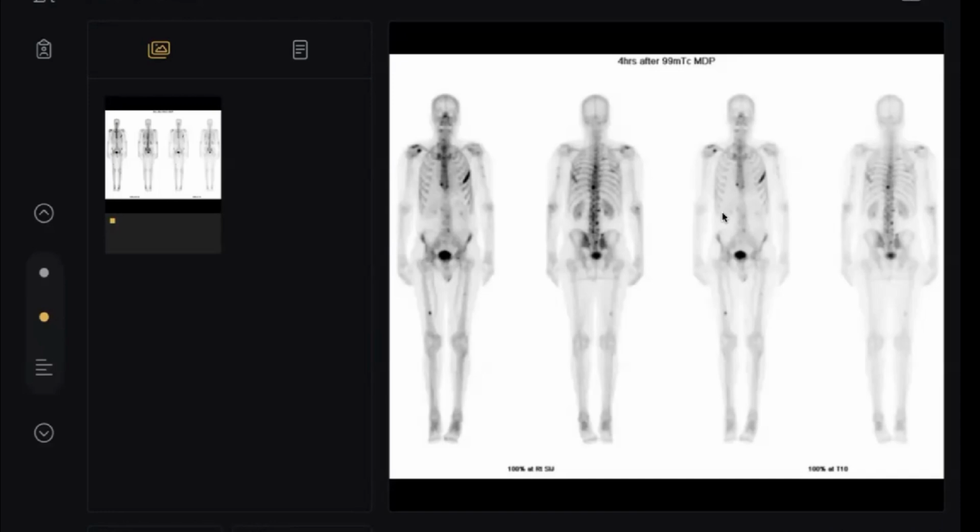What type of metastasis? Could you guess the primary? It's an osteoblastic metastasis. If the patient is male, most likely it is from the prostate. Do you remember the history? Yes, it was a male patient, cough, pneumonia, 70-something. So it is most likely due to prostate cancer. Excellent. Thank you, doctor, so much.